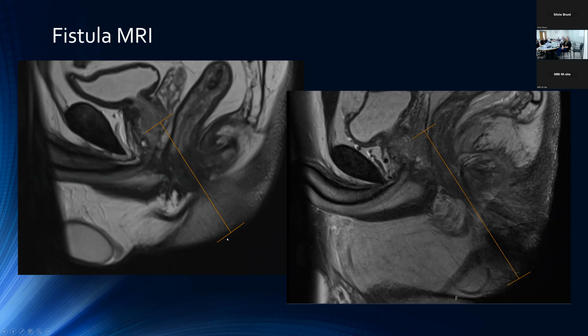Coverage extends all the way through the inferior gluteal fold, which may not necessarily be seen right in the midline, but as you scroll through a parasagittal or paramidline position, you'll pick up the gluteal fold and see how far inferiorly you need to extend.